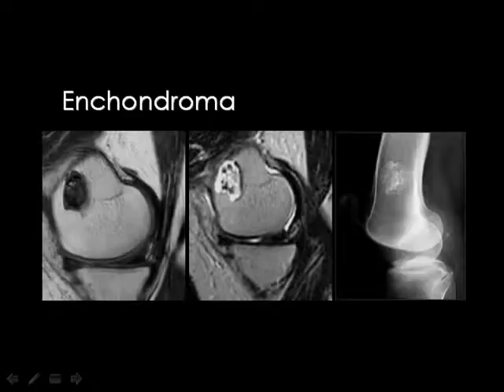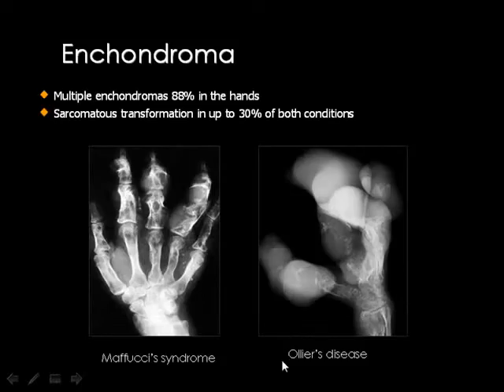If the enchondroma occurred in the long bones, you can also easily see this lesion. You remember the calcified lesion in the medullary cavity of the knee, and this is the classic appearance by MRI. The lesion is black in the T1, bright in the T2, while the matrix calcification will appear black in both T1 and T2. The sclerotic cortex will appear clearly in the T2 weighted image.